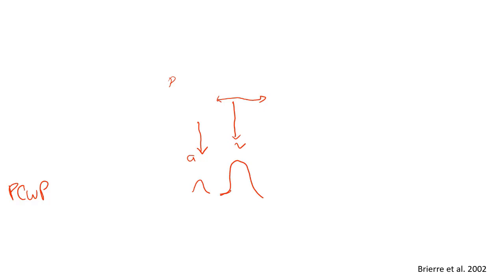We already talked about this a little bit, so remember the V wave is ventricular systole. If the V wave is huge, that means that something is causing back pressure during systole. The only thing that really does that is typically going to be mitral regurgitation. So these are the large V waves of mitral regurg.